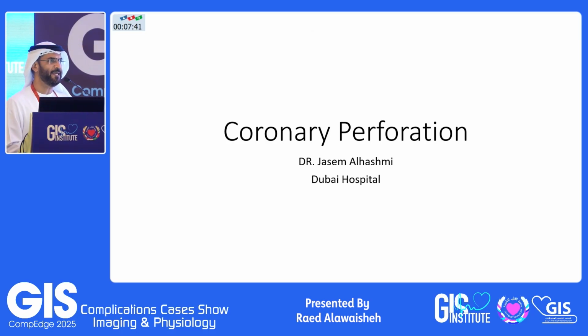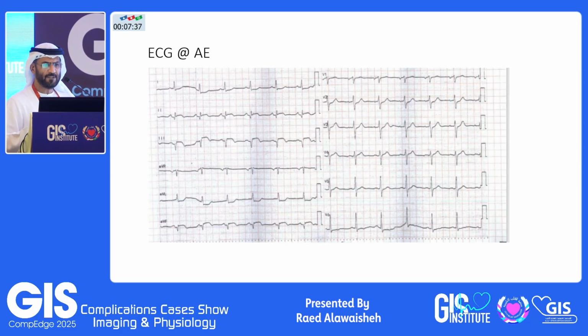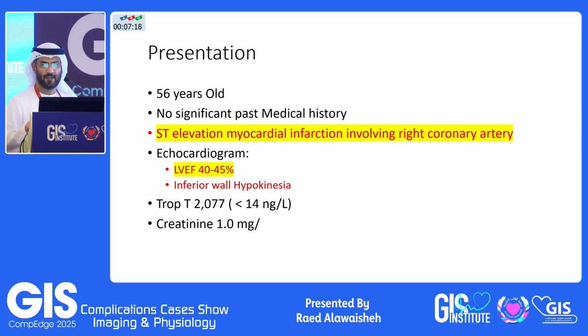He was having chest pain. So we did an ECG for him. Clearly seen, there is an ST segment elevation with a Q wave already established in the inferior leads, there are changes in the lateral leads, and there are some mild changes in the anterior leads. We did an echo in the emergency department, and the ejection fraction is around 40 to 45%.